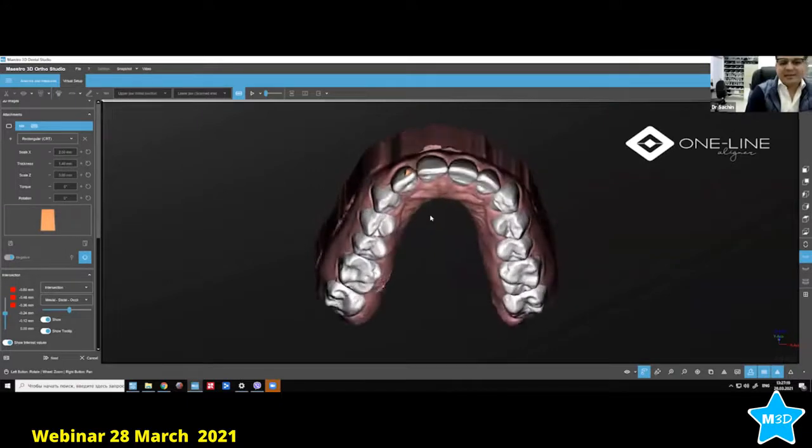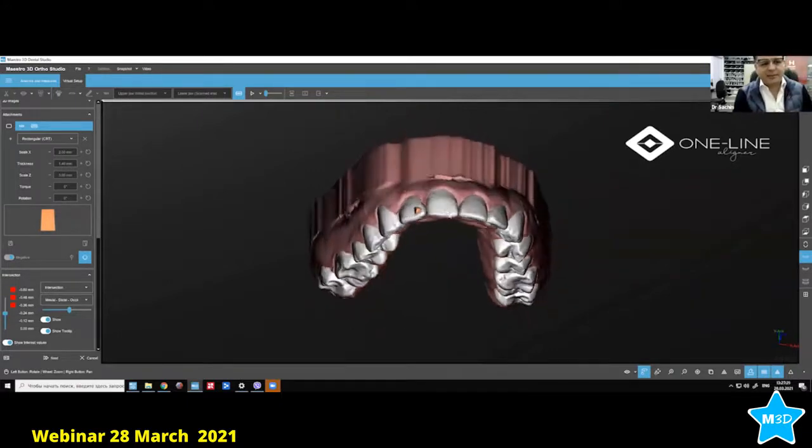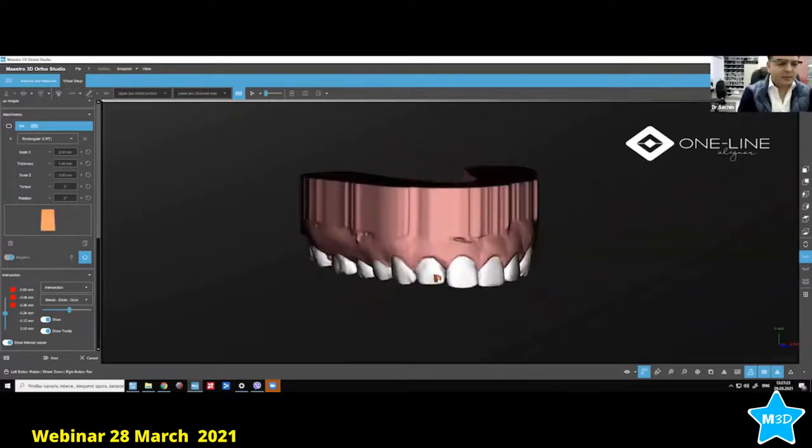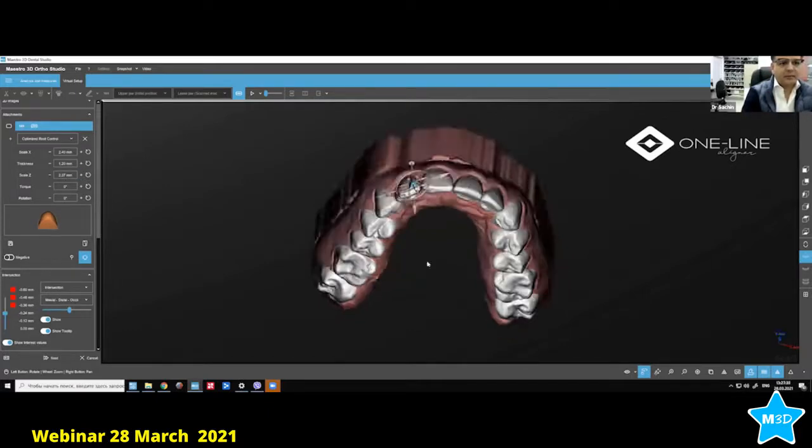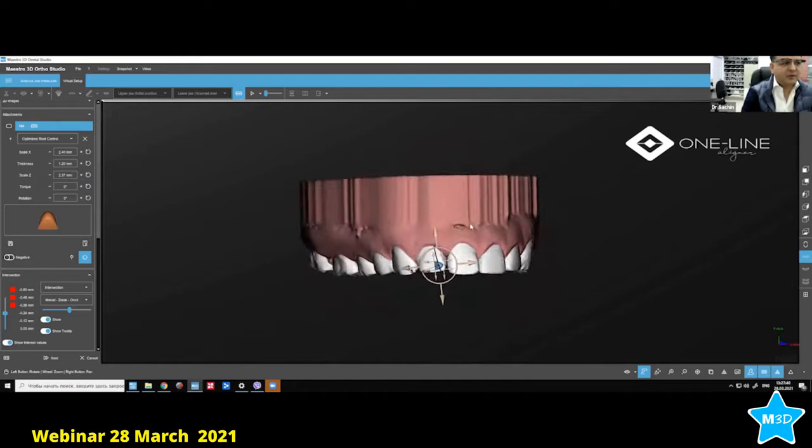Okay, what size now? Let's talk about the size. So this is the size which we have right now. It's a 1.1. We can have a 1.2. The x-axis, in this case, will be the vertical axis, particularly when you hold it like that, and then the z-axis, you can just grow a little bit. This is good enough. So you can just note down 2.4 for the x and the z-axis, and the thickness around 1.2, if you want to go for rotation on smaller teeth.